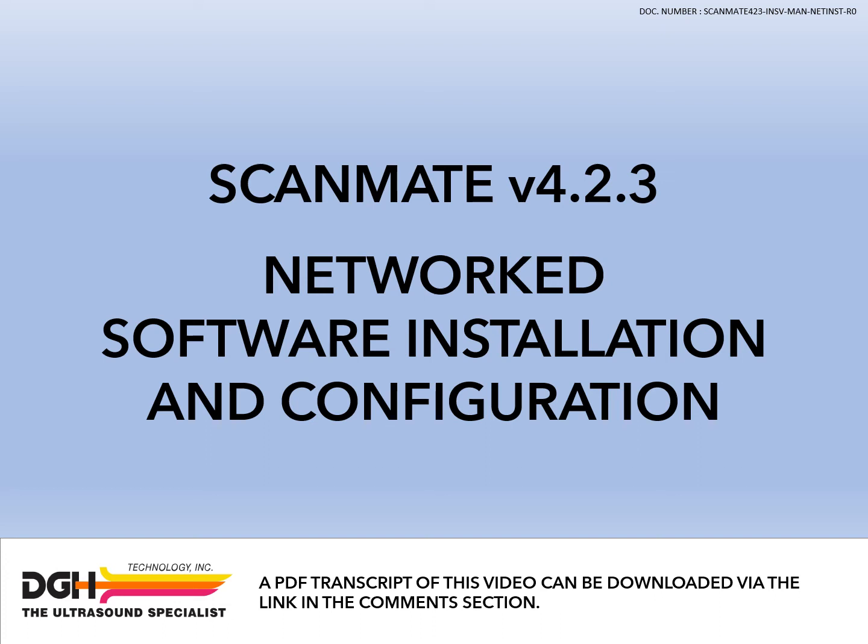This instructional video explains installation and configuration of the Scanmate version 4.2.3 software for networked workstations.